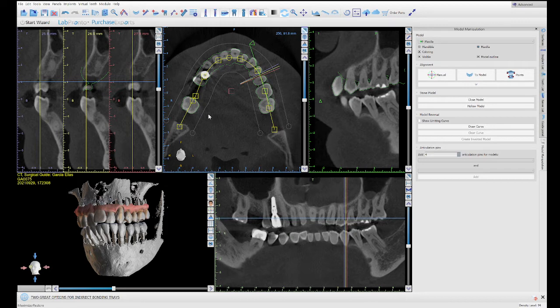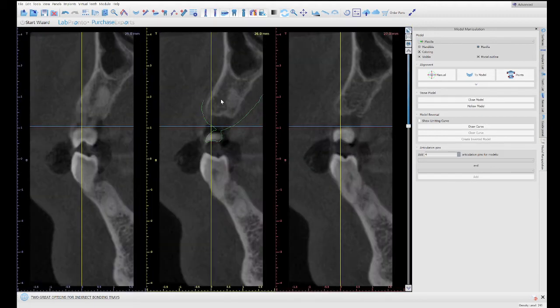So now, how do I verify that the stitching is proper? Because the stitching has to be proper in order for the guide to be precise, because you have to fabricate the guide on top of the model. So what I'm going to do is expand that upper left side window, and I'm going to go on the bar on the side.